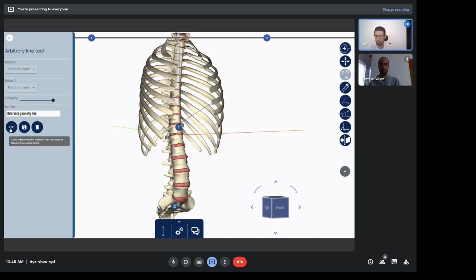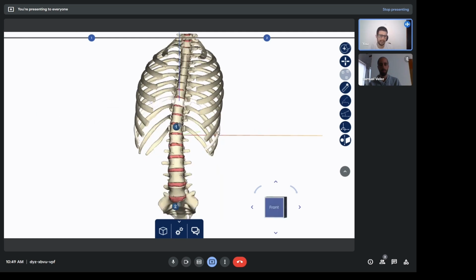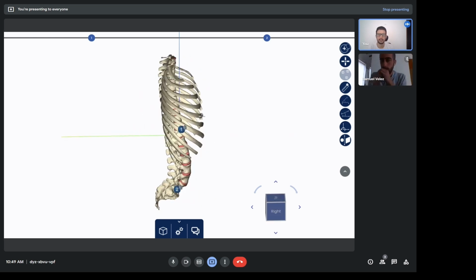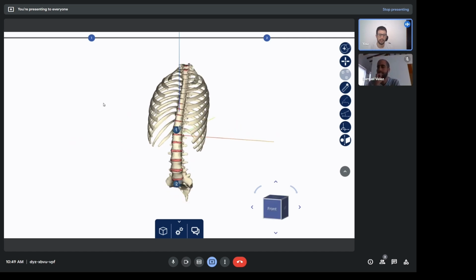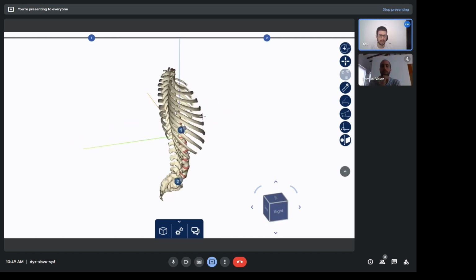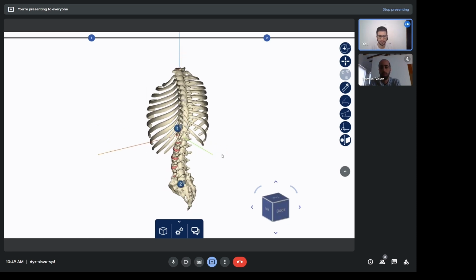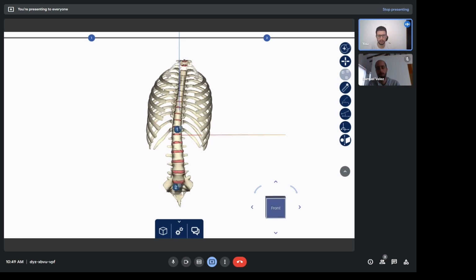So this was very brief, but nevertheless a good explanation and showcase of the different capabilities that this DISRP tool offers for the surgery case planning of various types. In this case, one of the lumbar cases. And so I hope this is explanatory, and we look forward to you using our tool.